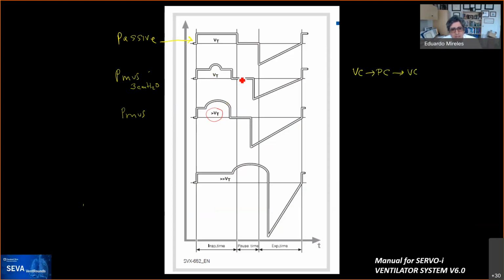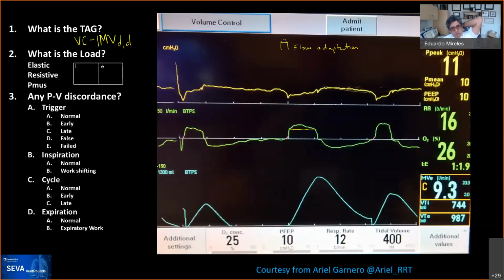You can see how the inspiratory time gets adjusted just to maintain the tidal volume within the range that you set. However, if the patient takes a big enough breath, a very high tidal volume, he may overcome the breath and it will shut down based on the patient's characteristics. So from being a mandatory cycle, which was this one, it turns into a patient cycle. So if it was triggered by the patient, this then becomes a spontaneous breath, which then turns the mode from volume control to intermittent mandatory ventilation.